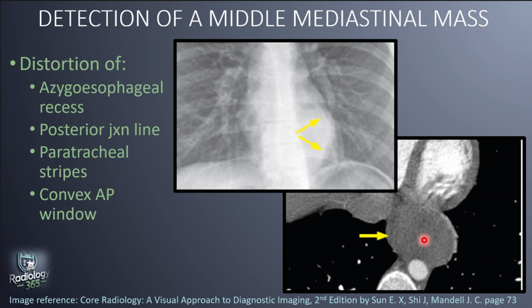So in these images, we see a displacement of the descending aortic stripe. If we follow this stripe, it's supposed to be the descending aortic stripe, but it bows outward towards the left here. And then after a contrast enhanced axial CT, we see this non-enhancing homogeneous mass effacing the esophagus. This was a liposarcoma, which is quite rare, but the point is the plain frontal radiograph gave us an indication that there is a visceral compartment mediastinal lesion bowing the aortic stripe.